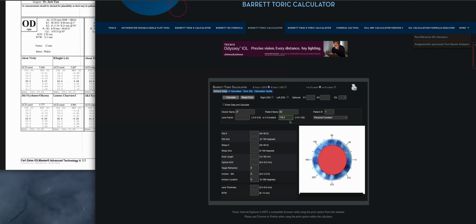If we're going to use the Alcon Panoptix, Panoptix Pro, that's going to be 119.1. 119.1 is also for the LAL or the LAL plus. So really you're dealing with just two numbers here. If we're doing any Johnson & Johnson lenses, it's the 0.3. If we're doing anything else, basically with me, it's the 0.1. So most of these we're going to be doing the Odyssey at 0.3. And I like to think, Odyssey trifocal 0.3, and the LAL monofocal, 0.1. Nice way to remember.